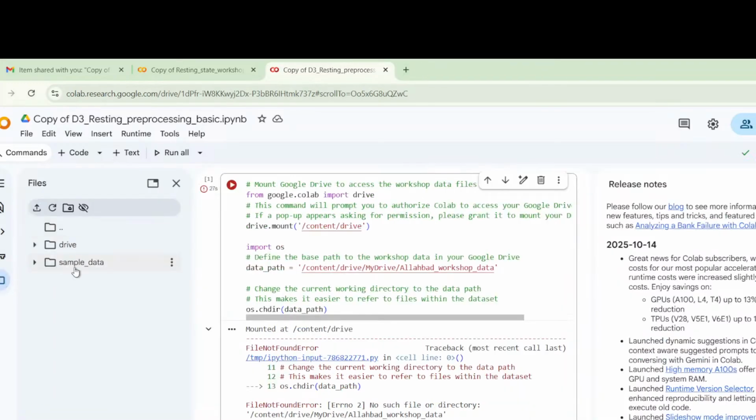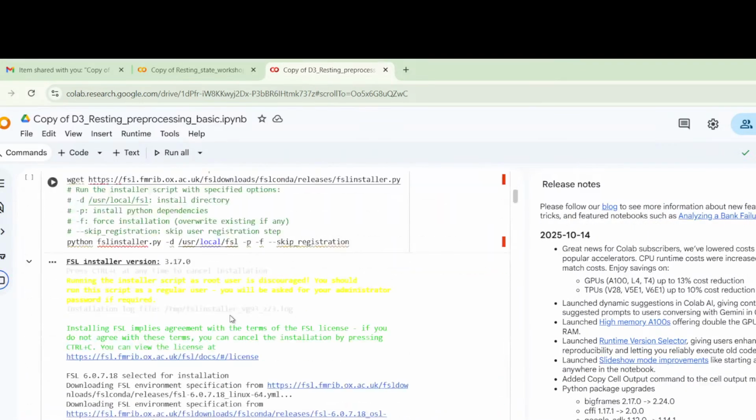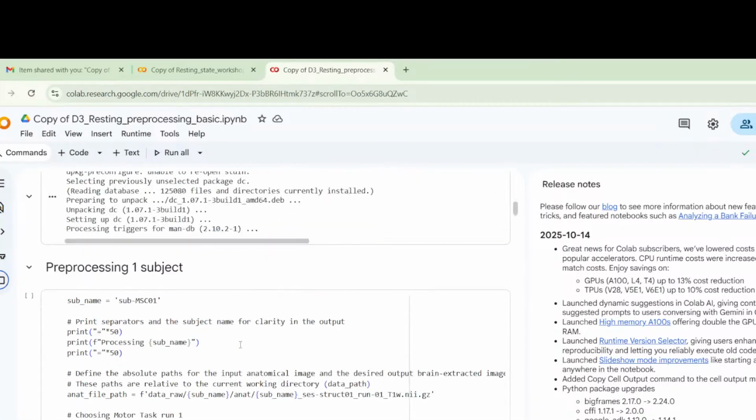So it is going through the different number of data points, right? So it will go all the way till 818.